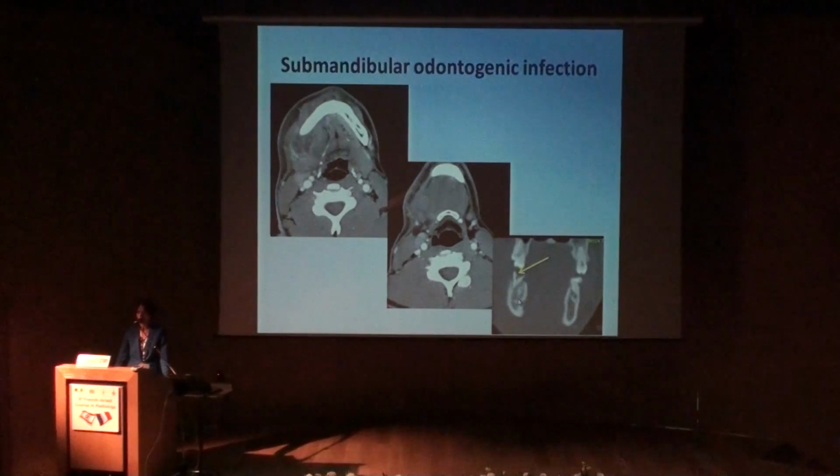It can also be related to chronic bony changes from the chronic inflammation. And you can also see other signs of infectious process in the neck, which are haziness of the subcutaneous fat, some fluids around the facial planes, and reactive lymphadenopathy.